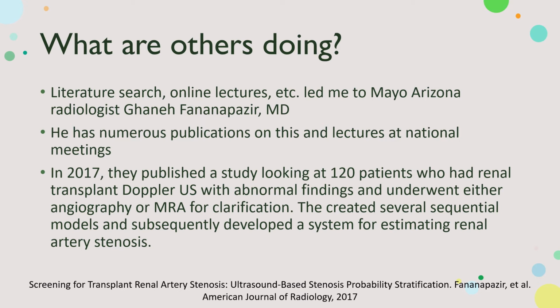And so it started in 2017. They did a study where people had abnormal Doppler findings, and they went on to either angio or MRA. And they have worked with the transplant teams and nephrologists and everyone at Mayo and have developed this system.